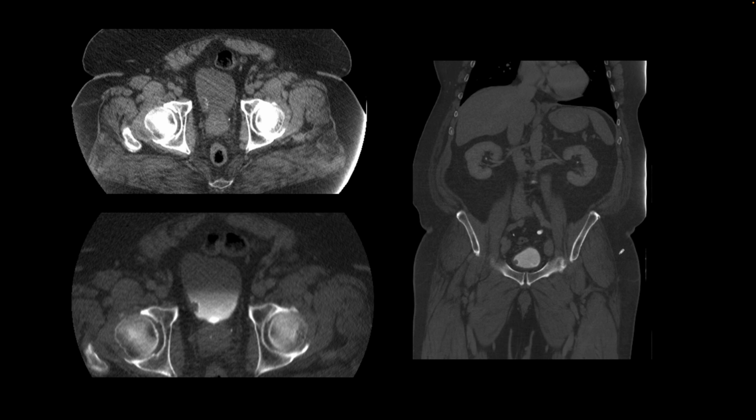This is our next patient. We performed a CT urogram where we acquire non-contrast enhanced images of the abdomen and pelvis first, right here showing a tumor or a suspected tumor arising from the right wall of the urinary bladder. Generally, these tumors have some calcifications on their surfaces, so it may appear exactly like this.